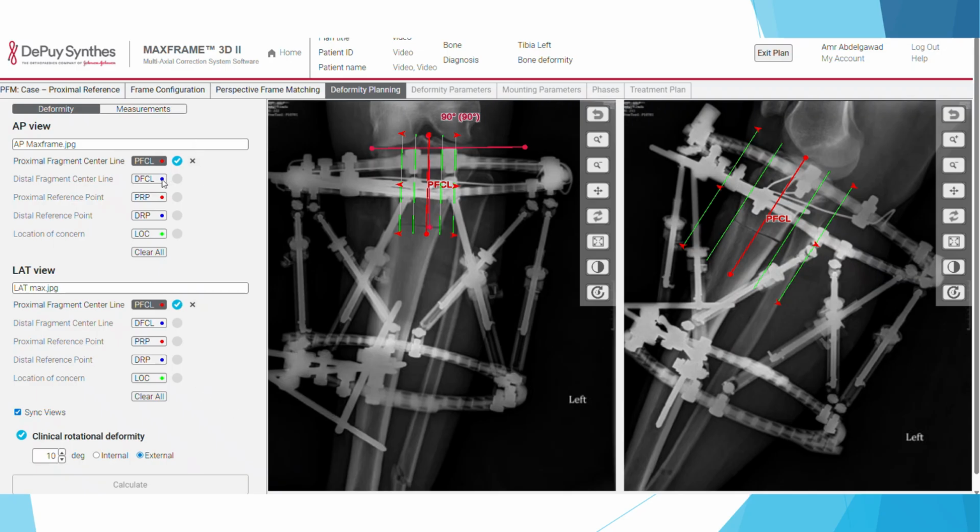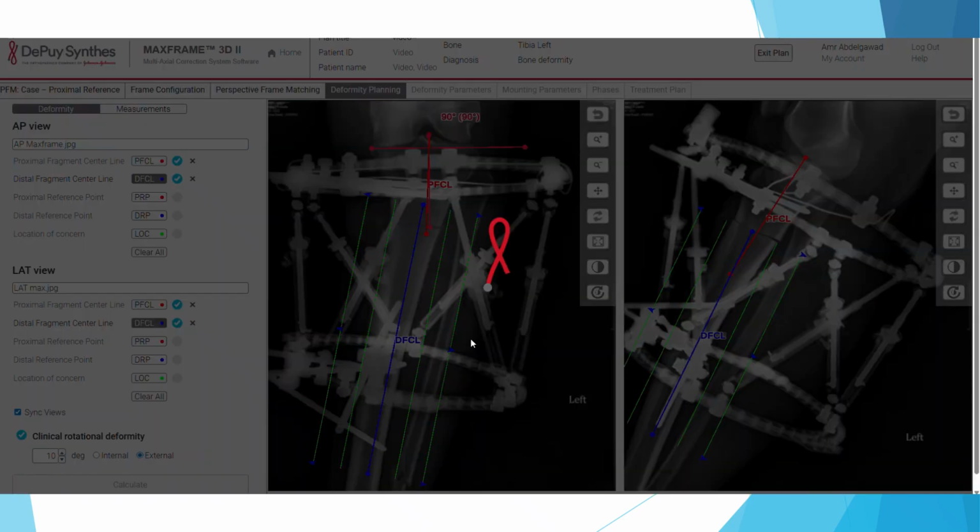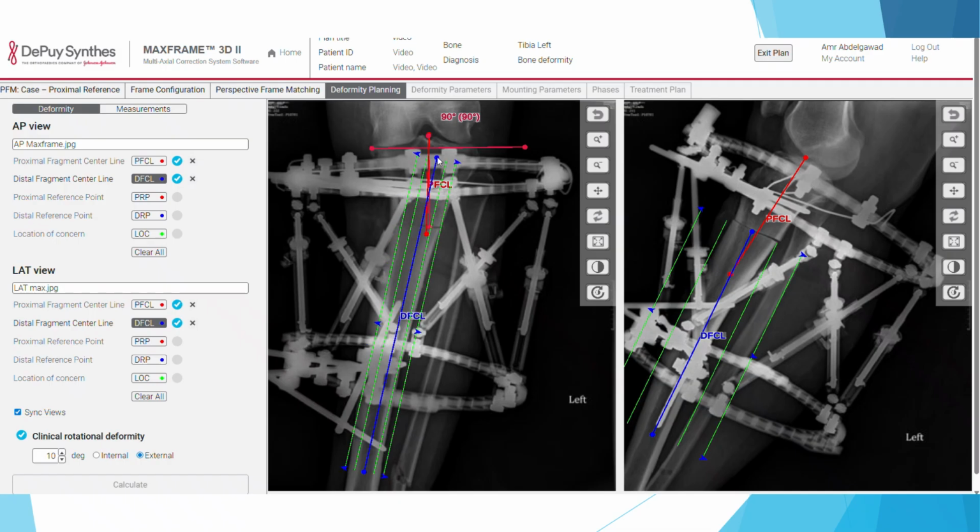And then you go distal. Then you go here, distal. Here it will help us to have the alignment. So we're here in the center and then we extend that line here. Let me just go this way slightly. Okay, go here. Okay, that's very good here. So now we want to make it that there is no deformity here. So even if you get a deformity, you can always override it, as we said.